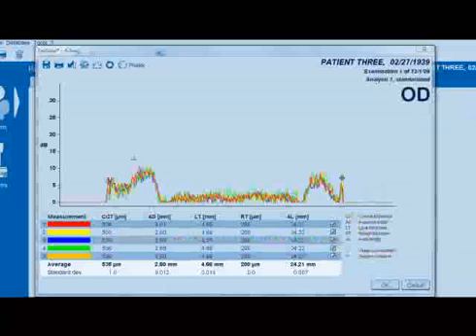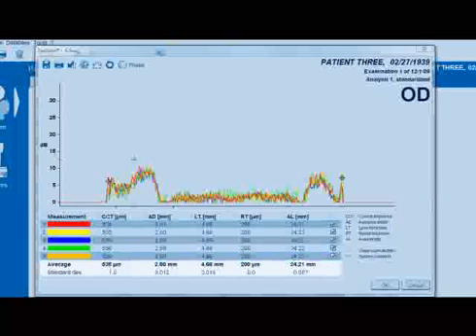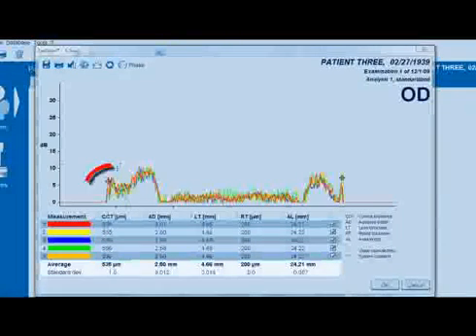After magnification, the area displayed on the screen will only be the lens. The displayed crosshairs will mark the anterior surface of the lens as well as the posterior surface of the lens. To manually adjust the gate, simply move your mouse cursor over the crosshair. This will result in the 4-quadrant crosshair.